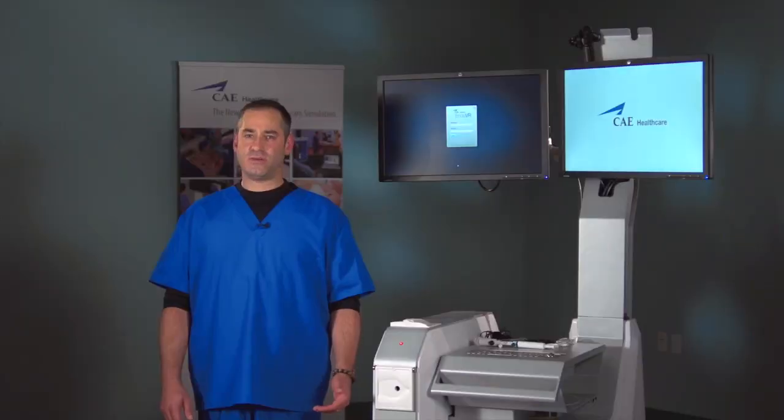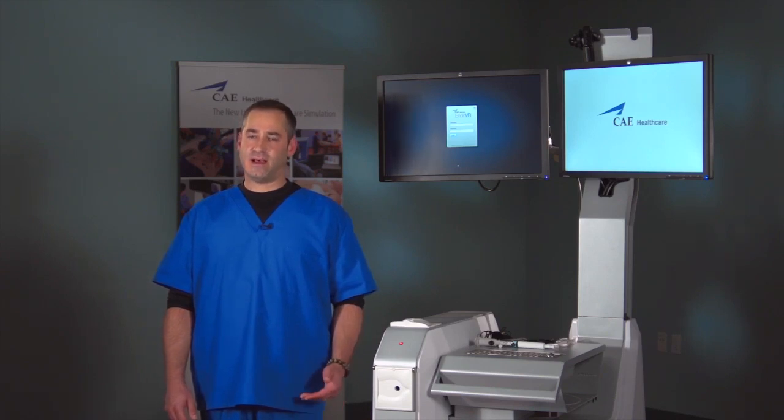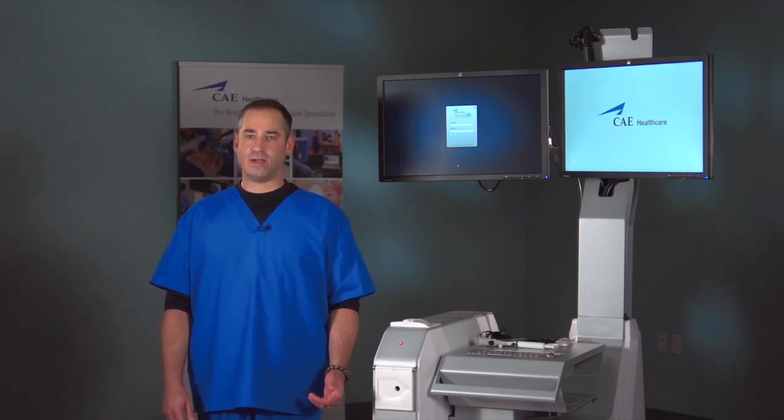So what is FES? FES stands for the Fundamentals of Endoscopic Surgery. Similar to FLS on the laparoscopic surgery side, FES has been established by SAGES, a world-leading organization of general surgeons. Because general surgeons do perform upper endoscopy and lower endoscopy, they had a vested interest in forming the basics of the fundamental skills that are required to become a competent endoscopist.